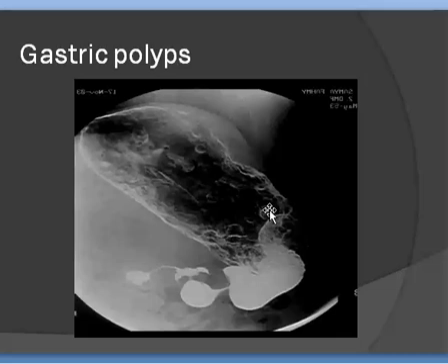Here we have a lot of things delineated with barium, here and there. This is the cap, and this is the pyloric antrum, and this is the pyloric canal, and this is where what we call incisura angularis is, and incisura angularis or peristaltic wave. And this is the fundus, and this is the body with multiple gastric polypoid lesions.